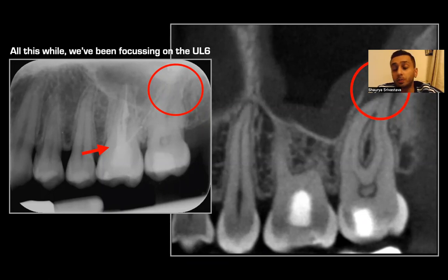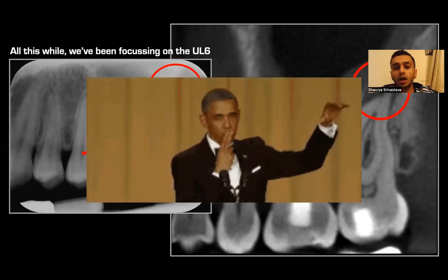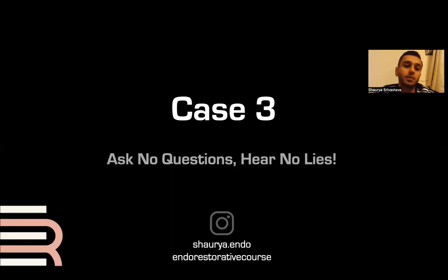You can do a percussion test, palpation test, and still the tooth can be asymptomatic. But if you're going to be taking a scan, you can at least assess the neighboring teeth well enough. So you can at least warn the patient so they're not surprised that there is another treatment to be done. They can choose whether they want to do it, because a lot of asymptomatic patients don't want to take on a new treatment. But they should still be well informed. Okay, so that really tells you a massive difference between 2D and 3D, and that's of course a mic drop moment, because you would have had no indication, unless there were symptoms, that tooth was involved as well.